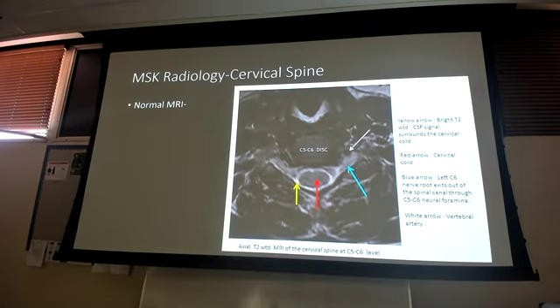Yeah, I'll do one more. All right, so normal MRI again, showing you some areas of this.